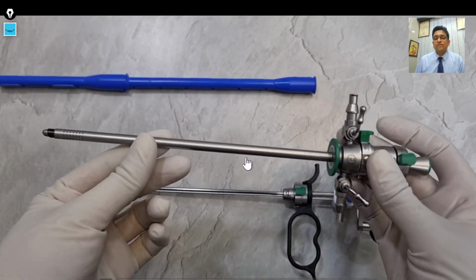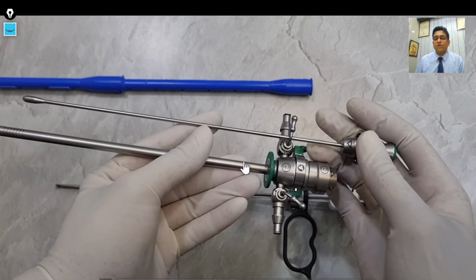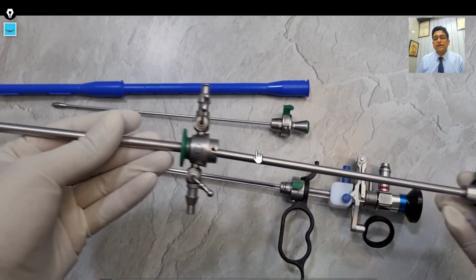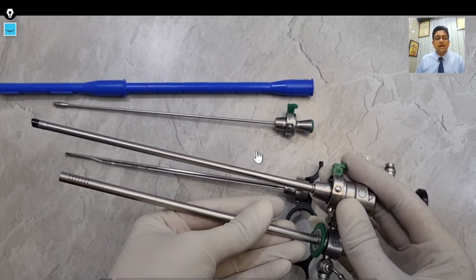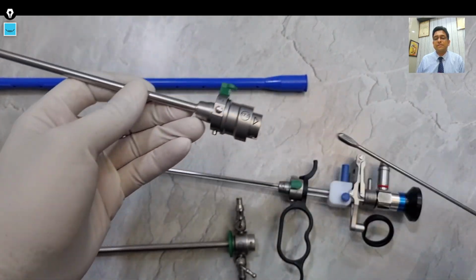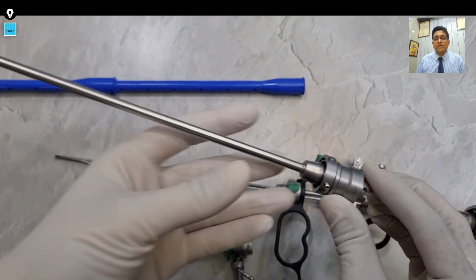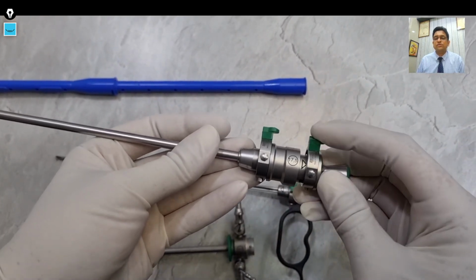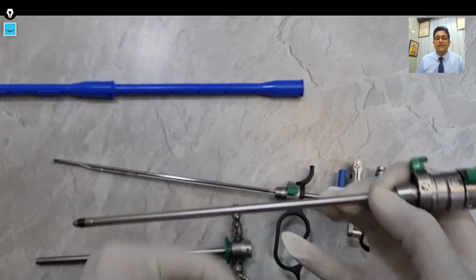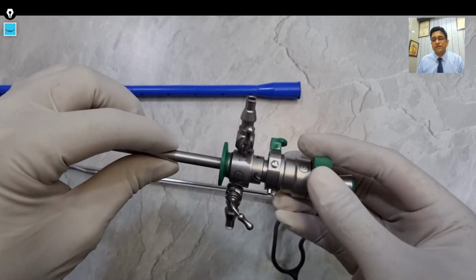This is the sheath of the resectoscope, the outer sheath and the inner sheath. You can see it has an obturator over here, and after the obturator, it also has an inner ceramic sheath and an outer perforated sheath. The ceramic tip is usually guarded when the resectoscope is stored by using the obturator. That's why during storage, the obturator has to be always kept inside and locked, and then the obturator is loaded into the outer sheath. The outer sheath has perforations.